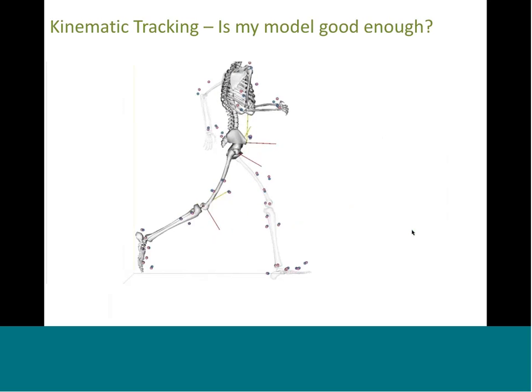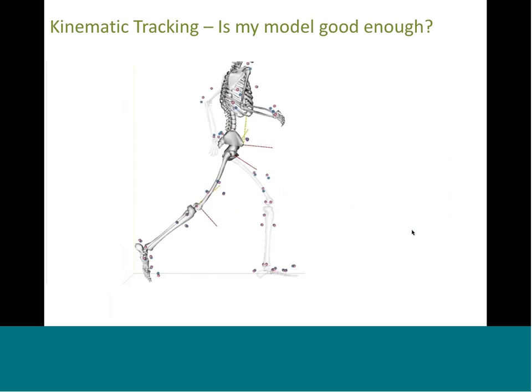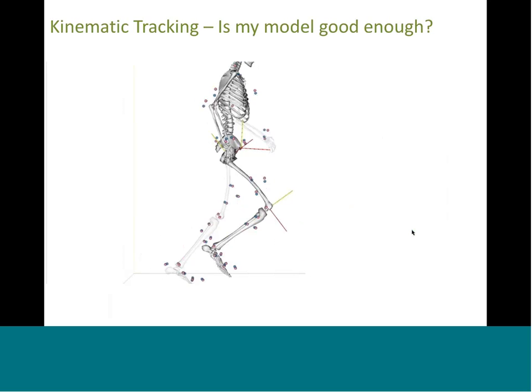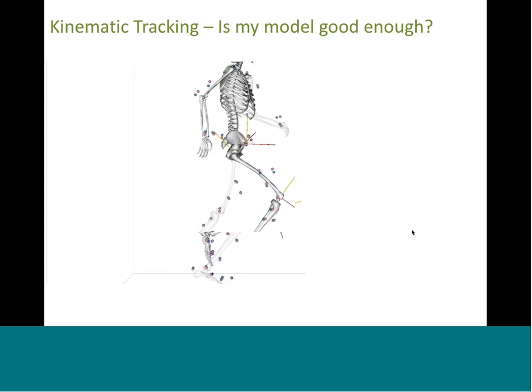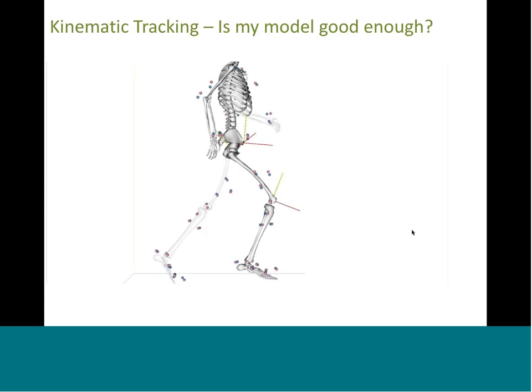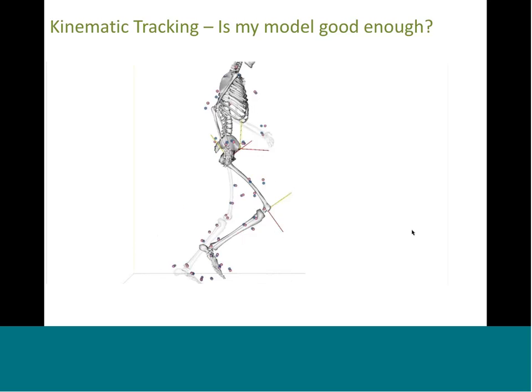When it comes to asking if your model is good enough after running inverse kinematics, I should warn you that it's still subjective. However, similar to scaling, there are still results you can use to help you decide whether it's worth retuning or accepting your results. The easiest and most basic first step is to assess the inverse kinematics results visually by comparing your model markers to experimental markers. You can slowly run your model through the motion and visually inspect how well the marker sets match in each frame.